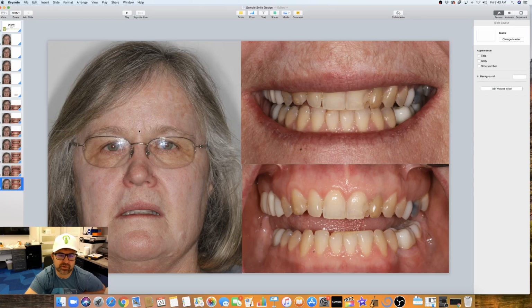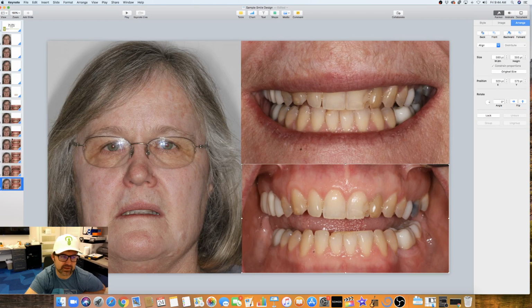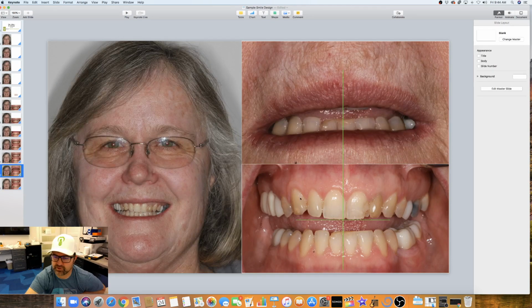At this point, we want to start to analyze this occlusal plane. And you'll notice, too, that there's this kind of roller coaster appearance, kind of a cant as well, that she'll probably want to have corrected. This over here too is longer or further down than this side. If we were to just put those lines back on here, if we're going to jump back up here, you could see that. You could see the discrepancy there.